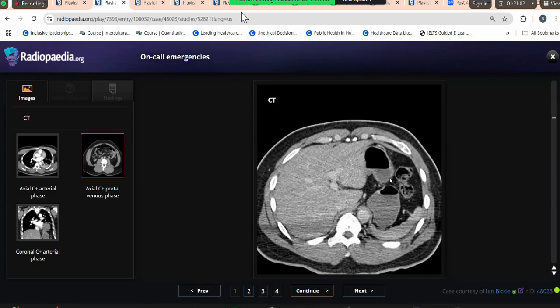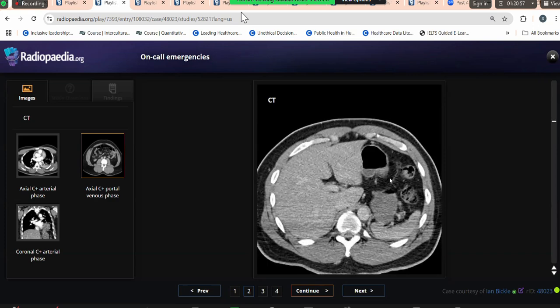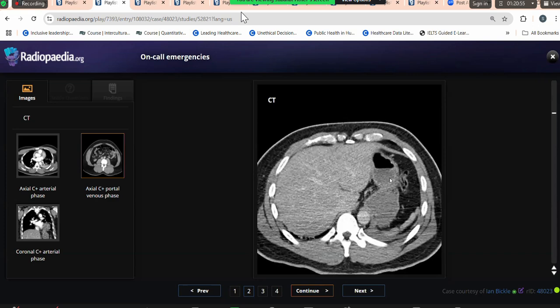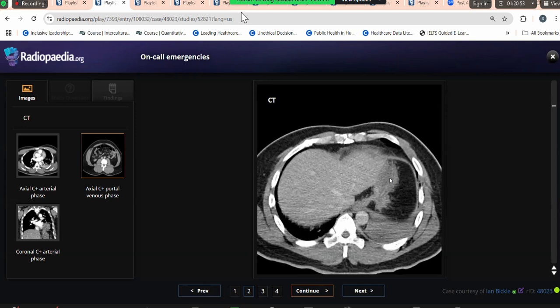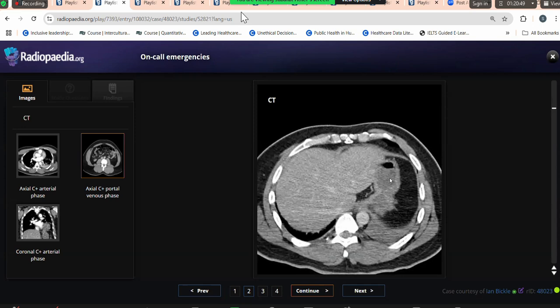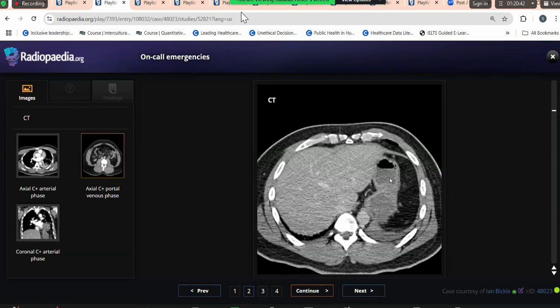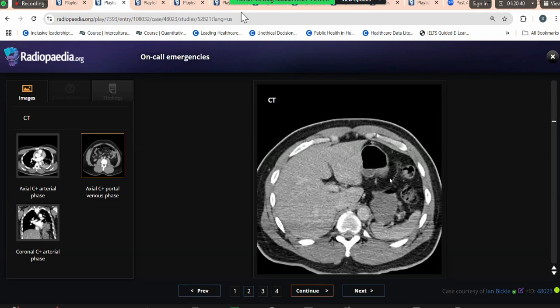However, on these axial sections, I cannot definitely make out the continuation with the viscera. Which viscera are you thinking of? It can be, ma'am, stomach I can separately appreciate. It can be part of colon, the transverse colon, splenic flexure.